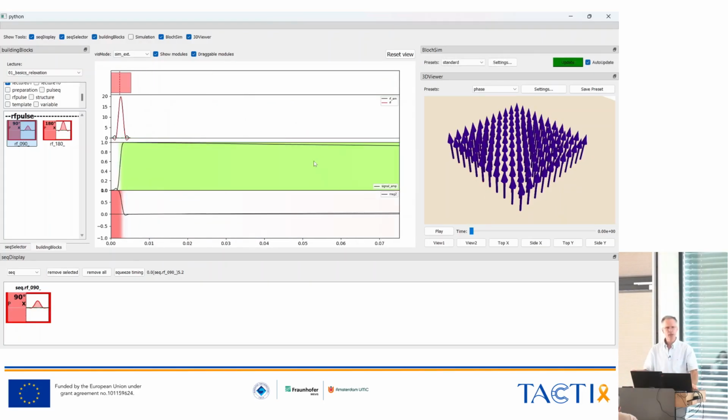You can either use a mouse for zooming, or you can use the touchpad two-finger gesture to zoom out. Sometimes, if you have a lot of spins to simulate, it is easier to just undo this auto update. Auto update means it is doing the Bloch simulation anytime you change anything in your display, because it is always calculating the magnetization relevant for what you are seeing.